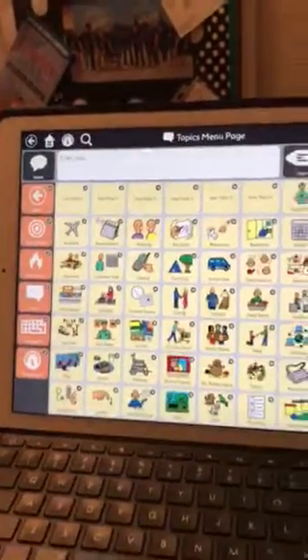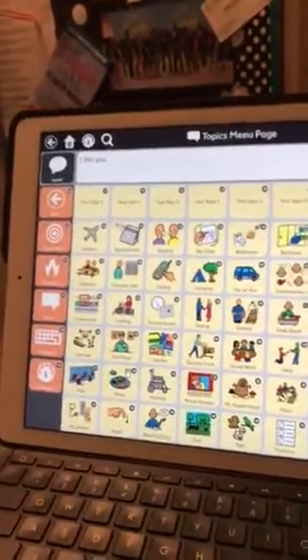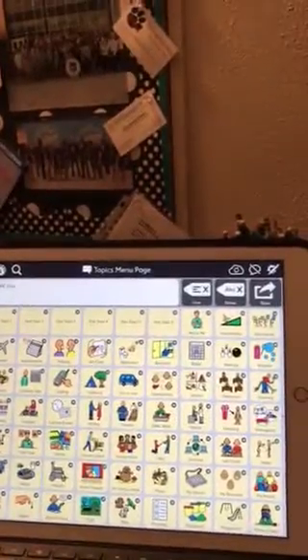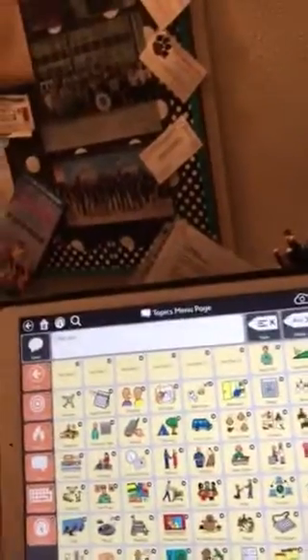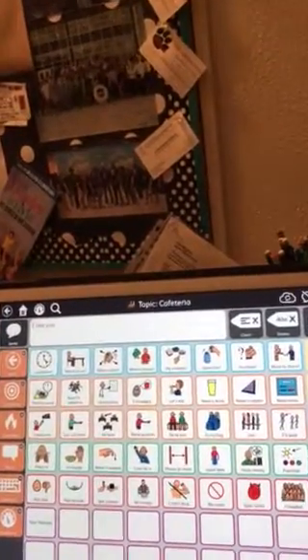So for a student to be able to use an app like this, or even a teacher, they are going to have an iPad, which is a downfall because they are fairly expensive. Another thing that's going to need to happen is to have basic iPad skills. So being able to unlock the iPad, being able to have the mobility to actually touch those things. And of course, some of the things are more obvious than others by their pictures. So for a child with limited reading ability, this could kind of be hit and miss.